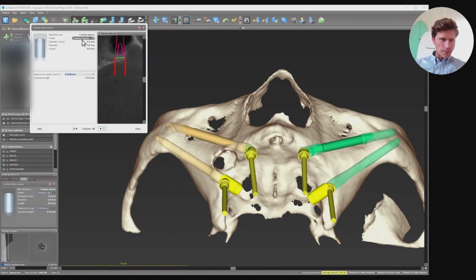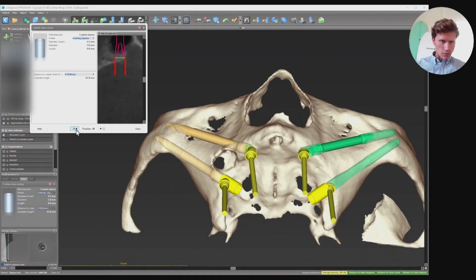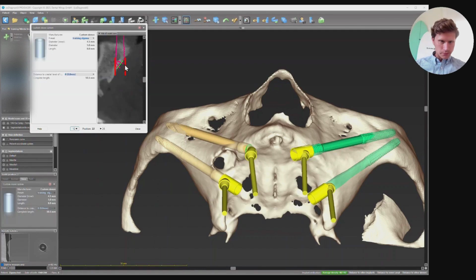The same sleeve, training zygoma. Oh no, sorry, that was incorrect. Sixteen, 22, 26, and 22. Here you can see that the sleeve finishes in the bone area. We need to put it a little bit out. Maybe like this. That's why I created different distances.